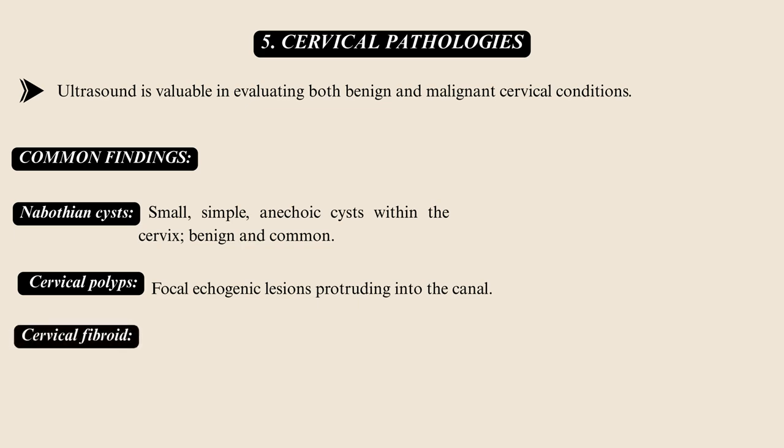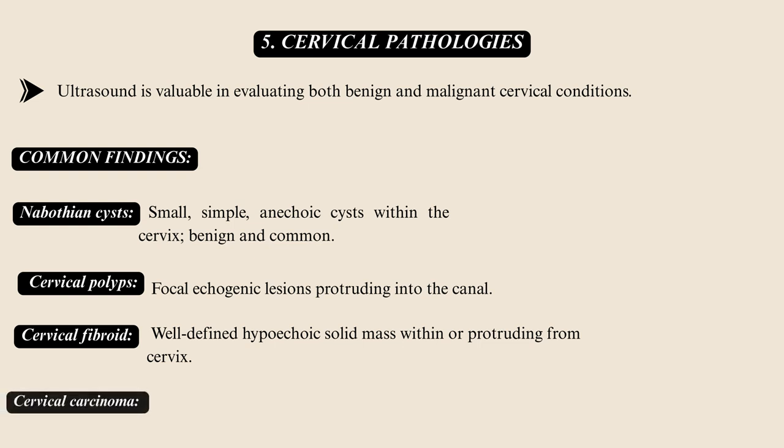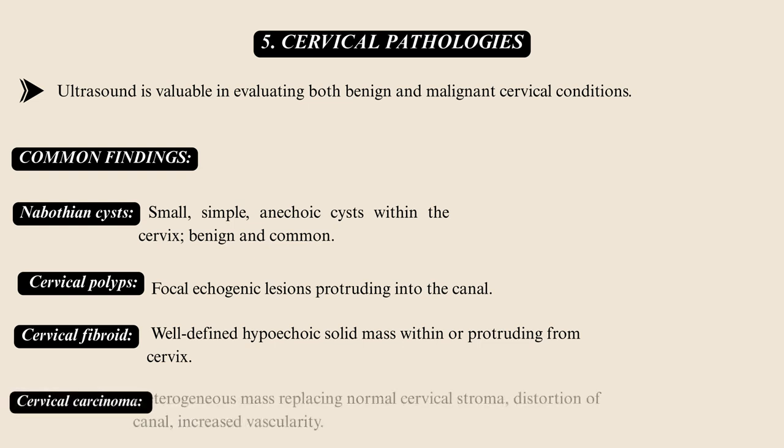Then is cervical fibroid, which is well-defined hypoechoic solid mass within or protruding from cervix. Cervical carcinoma, heterogeneous mass replacing normal cervical stroma, distortion of canal, and increased vascularity.